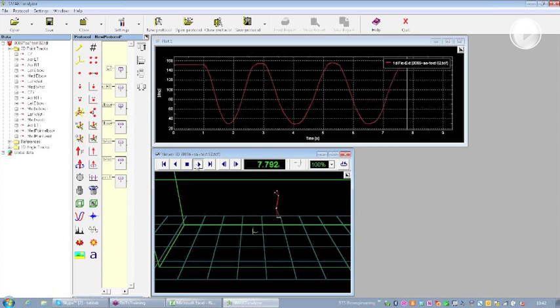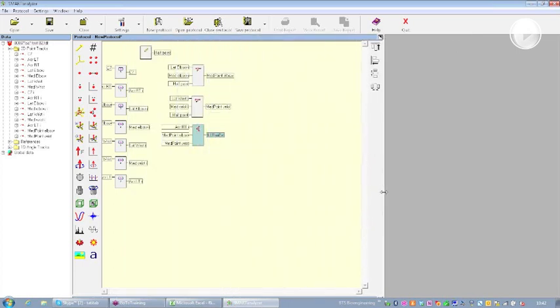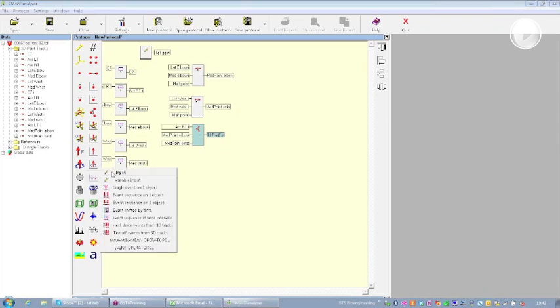Okay, so what is important is to select the maximum over the track of the angle. How can we select the maximum over the angle? Using the event tool. We click on event and we select event sequence on one object, because of course we are not going to get just one maximum, but more than one.